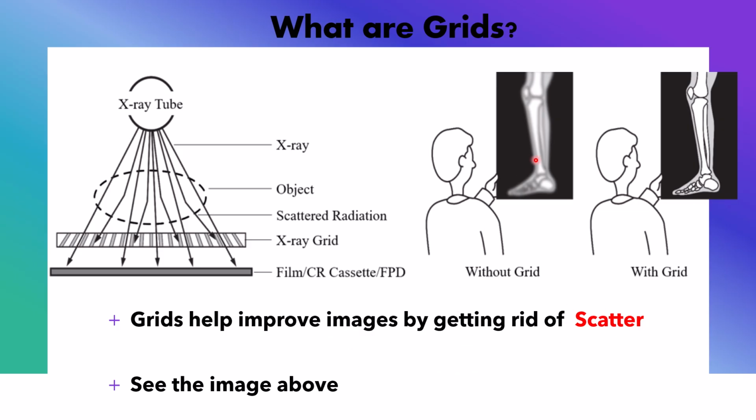If you look at these two images, this is exaggerated certainly, but without a grid, you can see how it's a little bit fuzzy, and here with the grid, the image is very plain. And you'll be able to see that in images, especially thicker body parts, if you forget to use the grid.